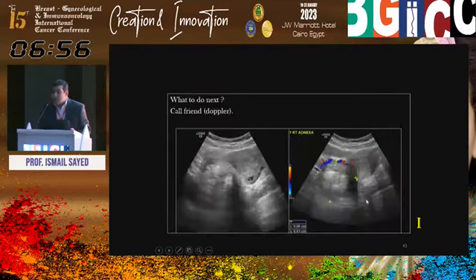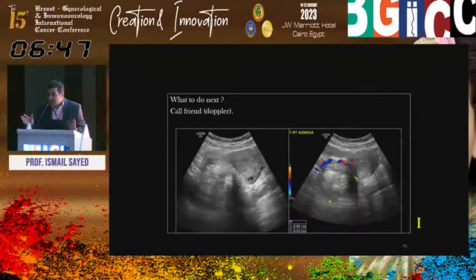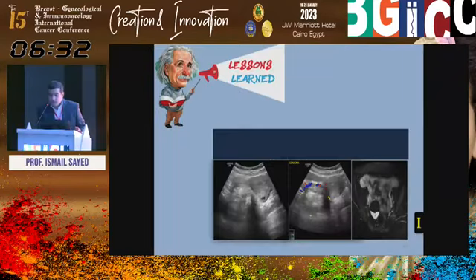So remember, dermoid is a great mimicker. It may have an appearance similar to bowel gases and food residue. If you get this suspicion, please complement it, either with short-term follow-up or MRI. Use the color Doppler to guide you. Look for mass effect. So this case is a dermoid cyst.